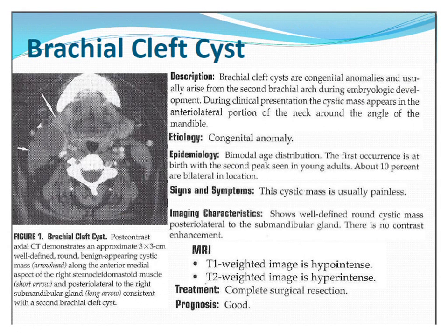There are just a couple of images of some neck pathology here at the end. One of them is a branchial cleft cyst. It's a congenital anomaly that patients may or may not know that they have until later on in life. Sometimes patients just notice that they have a swelling on the side of their neck or face. It can go anywhere from about halfway up your cheek, where the angle of your jaw is, down to your lower neck here. It just depends on what the origin is.